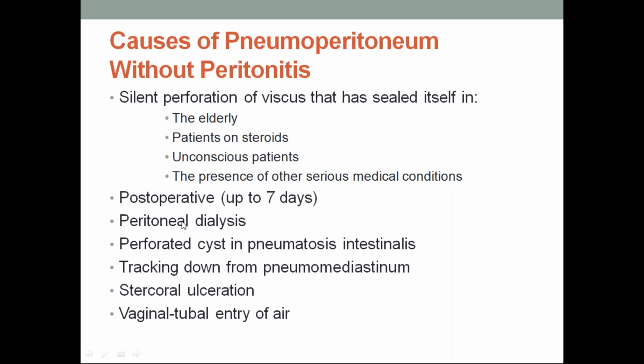Normally, during surgery, the surgeons induce gas into the abdomen to freely perform their surgeries. They will induce gas into the abdomen. In those conditions, it mimics pneumoperitoneum. Without any peritonitis, we will see gas in there.